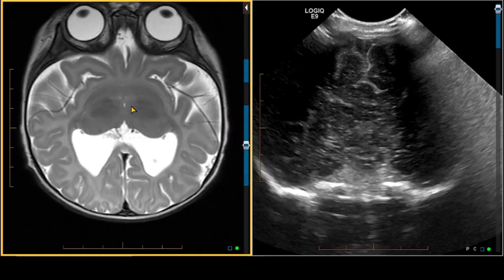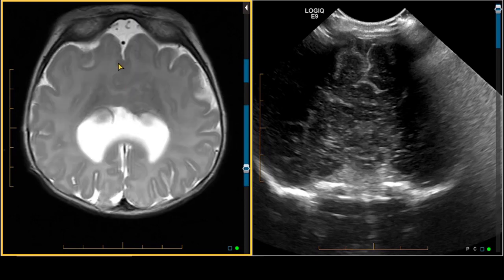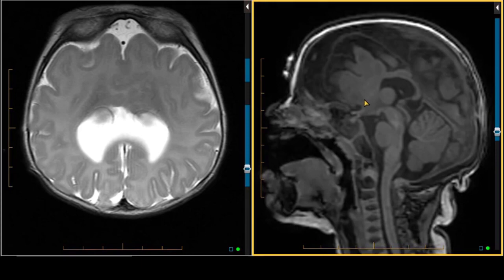An MRI is performed showing some fusion of the thalami, which is a diencephalic structure, and anterior midline continuity across the expected location of the interhemispheric fissure anteriorly. This corresponds with the appearance on the ultrasound. We also see a single or azygous anterior cerebral artery right here. Posteriorly, we see a falx cerebri, and we see two separate occipital lobes. So this patient has some features of holoprosencephaly, but it's not as severe as the alobar holoprosencephaly that we saw.